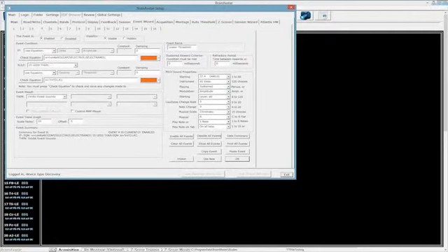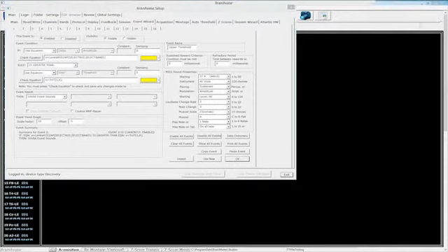And then finally is that same exact equation. If it is less than my lower threshold, then I want to inhibit event sounds. Now, why am I doing this in 4 events? It is very simple, because one event needs to basically drive it, and 2 events, these ones right here, need to basically make sure that it doesn't happen always.